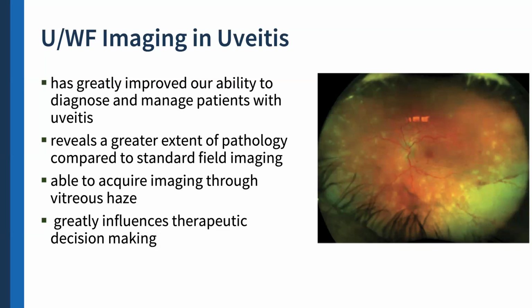So maraming mga parang images na if you take a picture using the standard camera, or if you do indirect ophthalmoscopy, it's hazy for you. But if you image it using the Optos, biglang mas marami na nakikita kasi the technology is just that good. Okay?